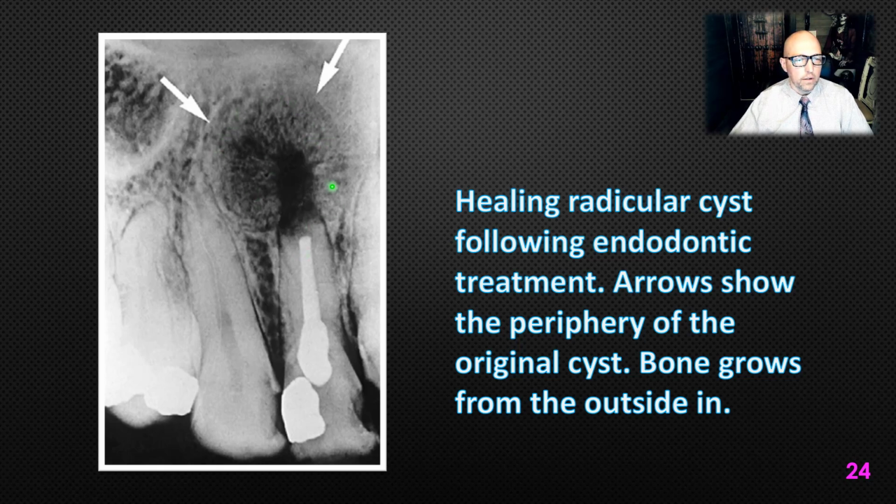And so it looks a little bizarre, but if you look at the borders of the lesion, you have these nice, well-defined, rounded borders. And then what's going on in here? This is a previous lesion that was excised, or actually in this case they say it was just treated by endodontic treatment, and it started to heal on its own.